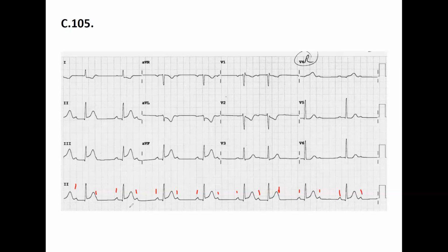We are not going to the ST elevation yet. When we're discussing ischemia, yes. So what does it mean? It means that not every P is conducted. Here, for example, it looks like every second is conducted. Again, every second is conducted.